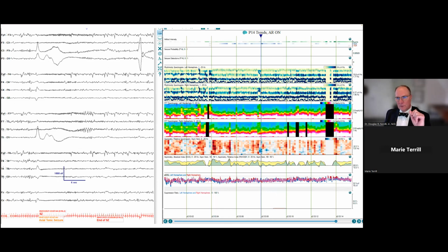Alrighty, the third seizure type that's challenging, you see here, was not in this case detected by Persyst, but sometimes it is a tonic seizure, and particularly a brief tonic seizure. But look, here's your clue on the rhythmicity spectrogram. You see a burst of activity, and look for it associated with a dip in the fast Fourier transform. Why? Because the frequency elements dropped out, but you got a buzz of higher frequency rhythmicity that shows up very nicely in the rhythmicity spectrogram.